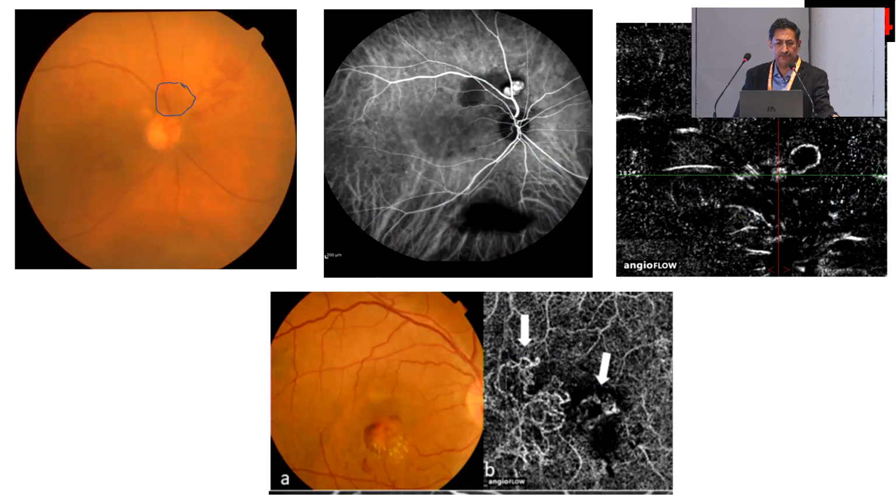This is another case, one of our cases. You can see the subretinal nodule, how nicely the polyps are seen. And in OCTA you can see this is a hypoflow structure, this is a hyperflow. And here also BVN you can see in another case.